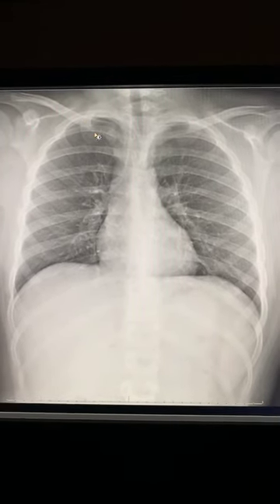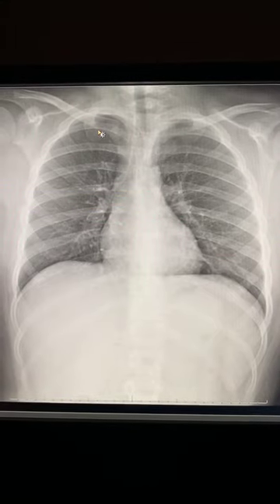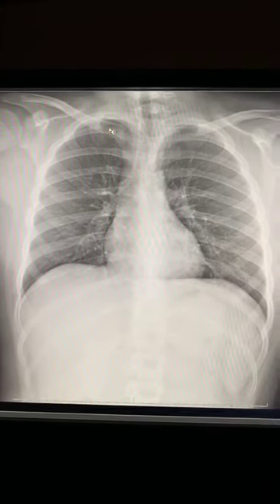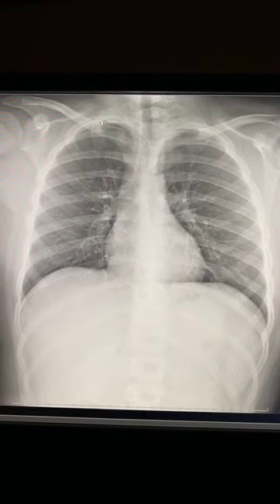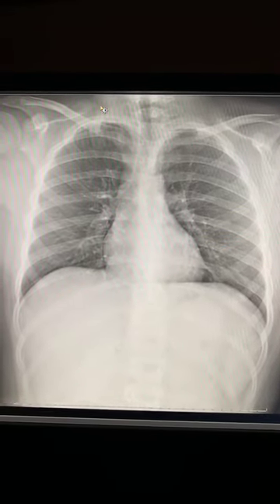All right, next thing that you're looking for, whether this is a trauma, whether this is a tall patient who's having shortness of breath, young, tall, male patient, start looking for pneumothoraces. And the reason I'm saying that is because they can be prone to getting a pneumothorax if their body habitus is kind of going down that route.